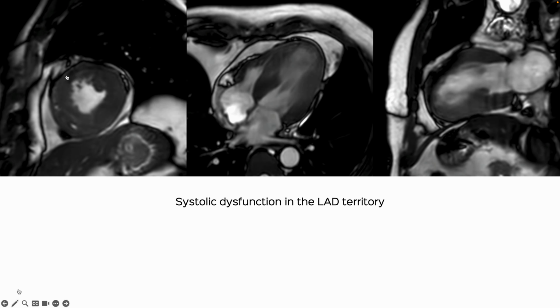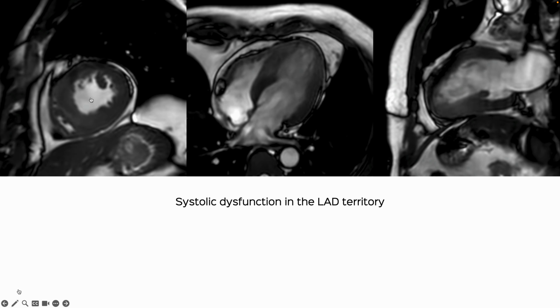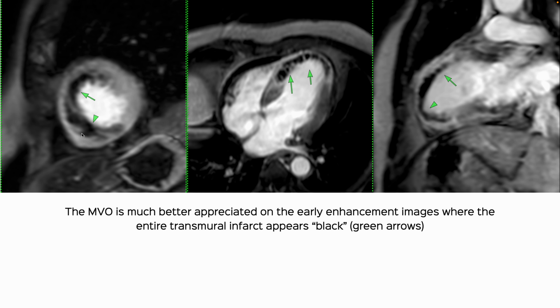So you can see how there's hypokinesia in the anterior wall and septum. There is some baseline hypertrophic cardiomyopathy, which is why the thinning isn't that significant. The late GAD images show a transmural infarct. It's beautifully seen on the 4 chamber and the 2 chamber, and you see these low signal areas within that represent microvascular obstruction. Obviously, the MVO is much better seen on the early enhanced images, as these green arrows show.